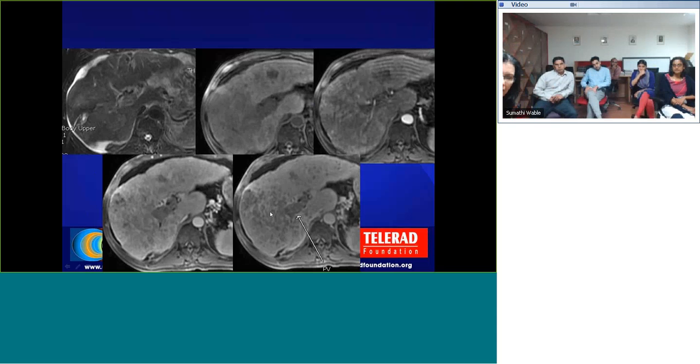All different areas of washout, and look at where the portal vein should be. Never followed the signal of vessels. Never filled up, and it's stopped in with tumor thrombus. So this is basically infiltrative HCC. This is something that you want to keep in mind, especially if the AFP is high. So that's why it's helpful for you to know everything that you can know about the patient.